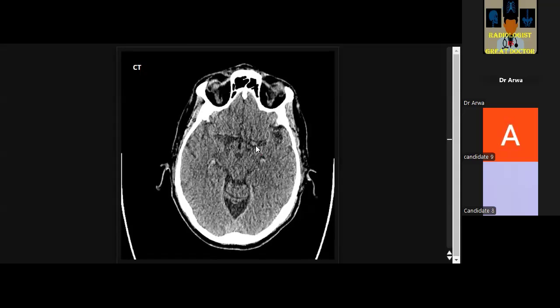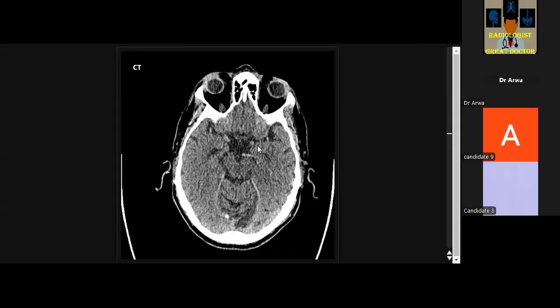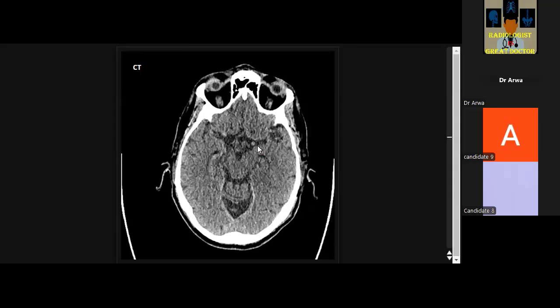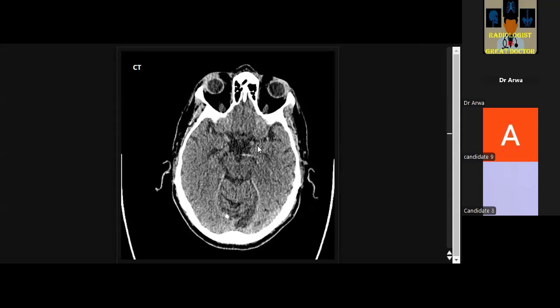What about the vessel posterior to the middle cerebral? Let me guide you again. Yes, this vessel, this left posterior cerebral, is asymmetric. There is no similar vessel on the right side. So this may be the pathology, right?